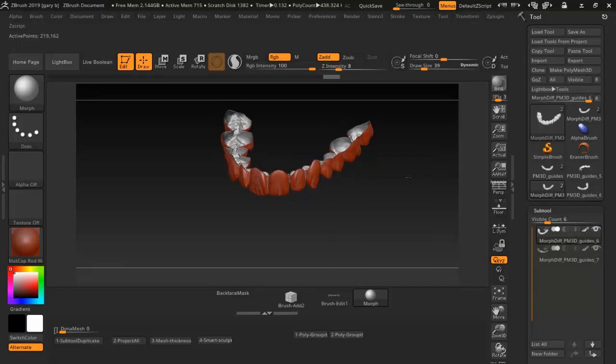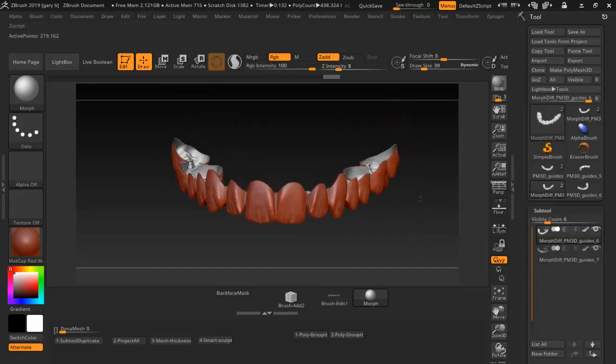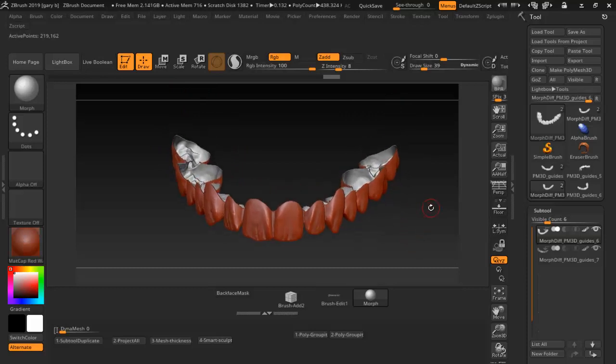Alright, this is what we call veneer. I don't know if you've ever seen them, but they're like mouth guards, or actually this one's going to be designed for what I call a snap-on smile. You could order some cheap ones online, but they're not even designed to fit your teeth. Alright, these are designed to fit your teeth. And actually, if you go to dentists and get these specially made, they can be a couple grand. You can make them yourself real cheap.